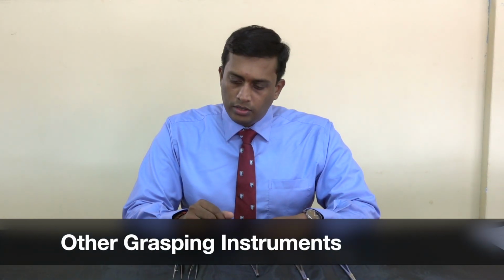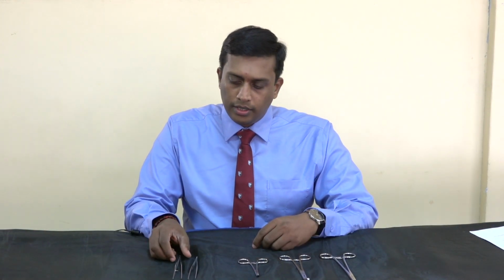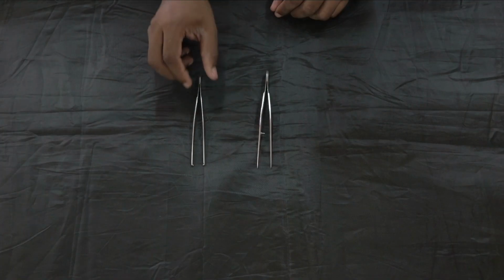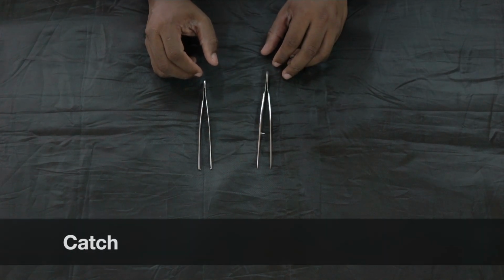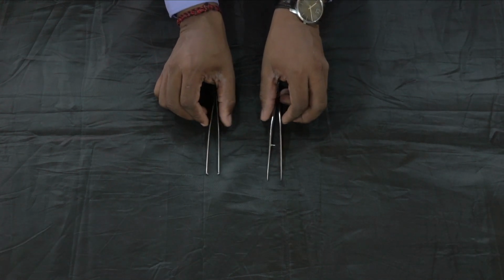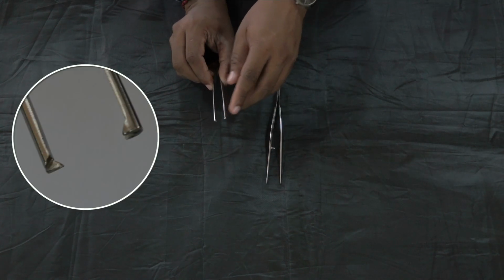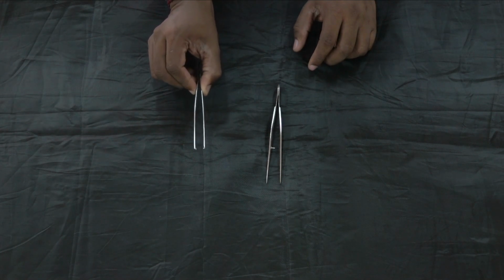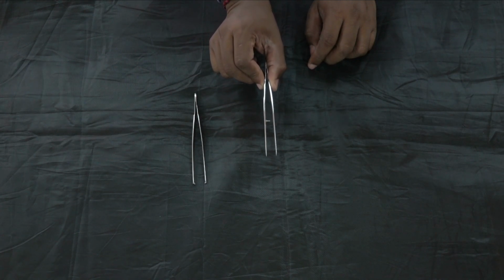Let's move on to another type of grasping instruments, which is also commonly used in gynecology and obstetric surgeries. This is called tissue dissecting forceps, which helps to hold the tissues during the surgery, and we usually call it catch. There are two types of tissue dissecting forceps. One has a blunt tip, and the other has a toothed tip. The toothed tip is usually used to hold the tissues tightly like the rectus sheath, and the blunt one holds the tissues gently such as peritoneum or bowel.